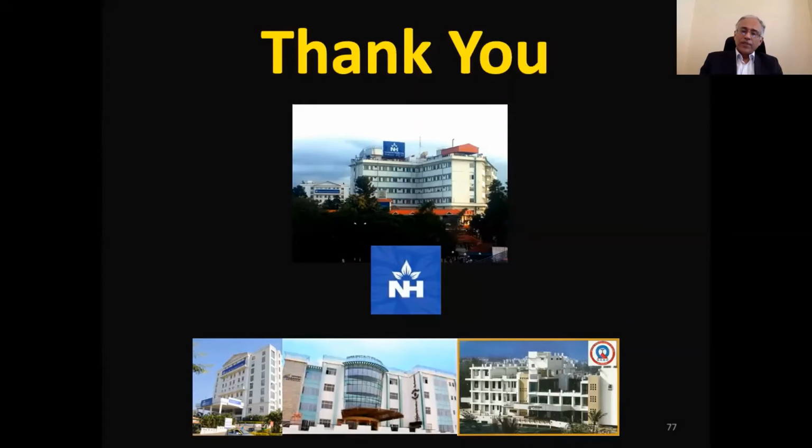So you have these different scenarios, and that's how one can look at pulmonary thromboembolism. And you can look at catheters which are there. I have seen quite a few patients where catheters have been put, and that itself has created a thrombus. So that's how the thrombus and the Chiari network, eustachian valve association is.